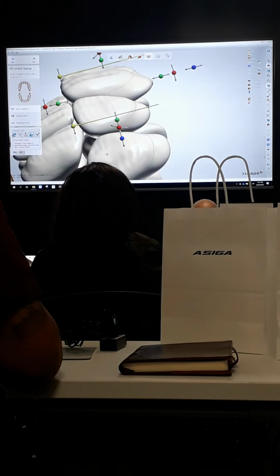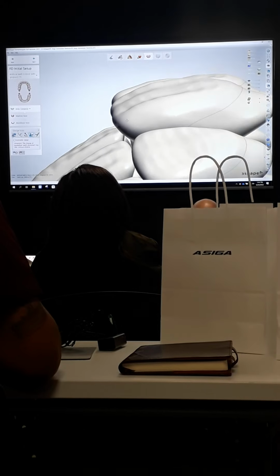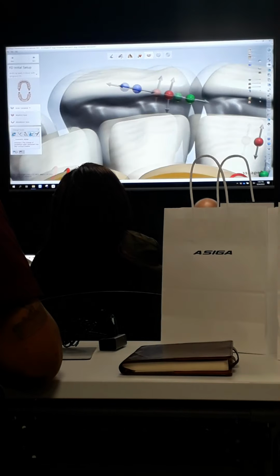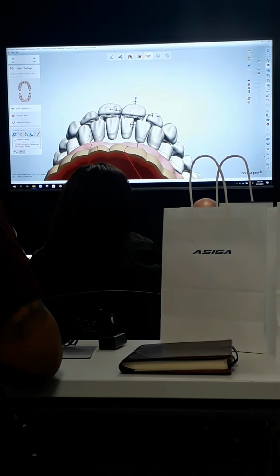I'll also take a look now and make sure that they're tilted the same way. So it kind of looks to me like number 9 is retroclined a little bit from number 8. So I'm going to turn off symmetric design and just tilt this one out a little bit so that they're on the same kind of plane. And then I can see that it tilted out a little bit that way. So I'm going to just kind of make sure that I get everything positioned.